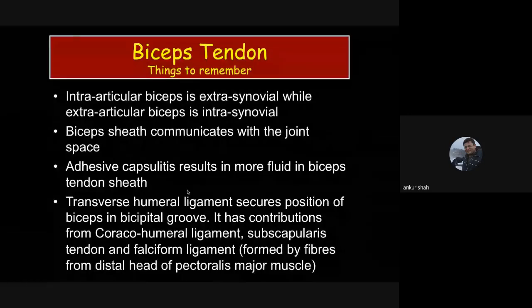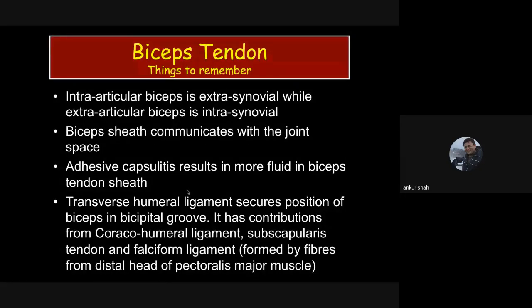There are two spaces in the shoulder joint where fluid can go. One is the biceps tendon sheath, second is the subscapularis recess. So if you see more fluid in these two areas, you should think about adhesive capsulitis. So look carefully for that.